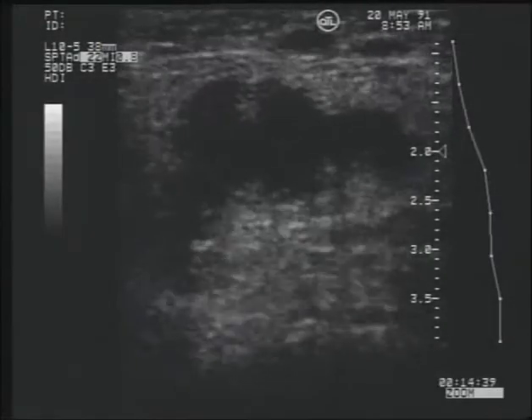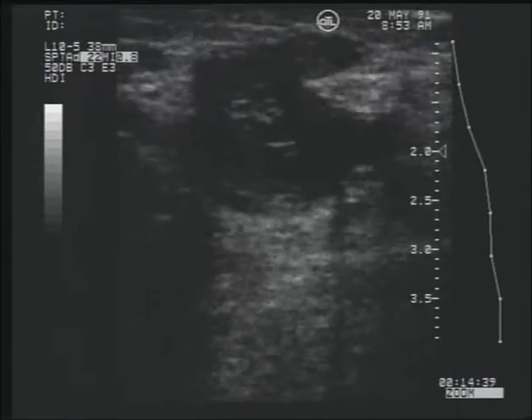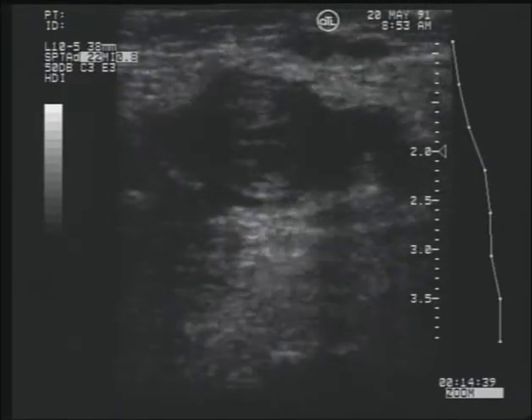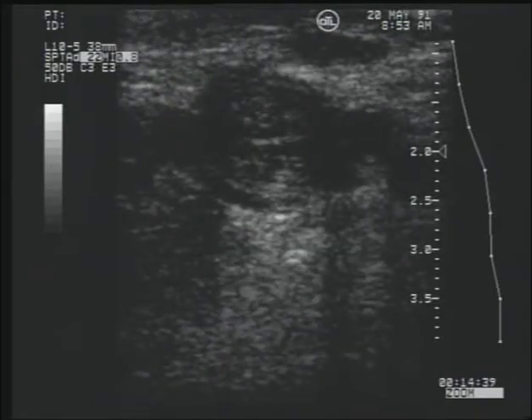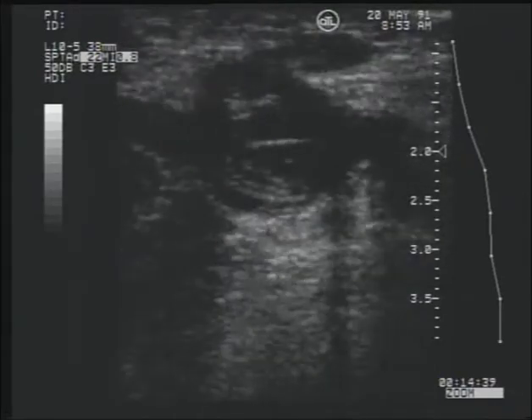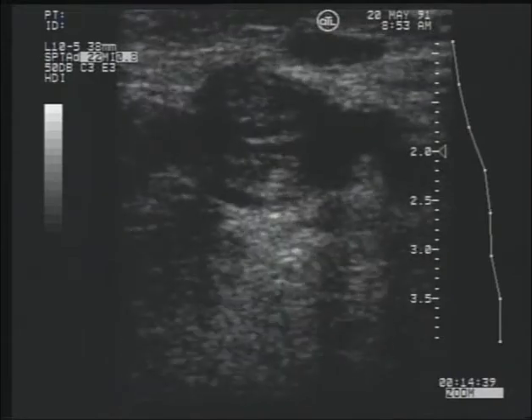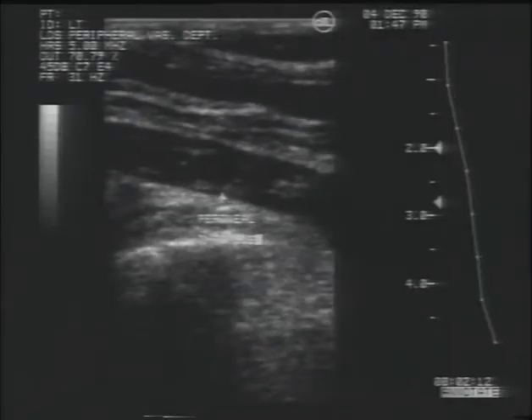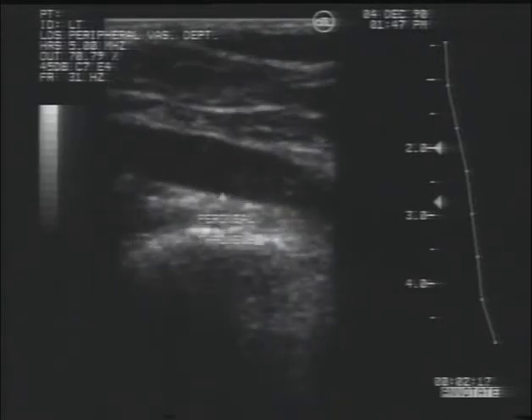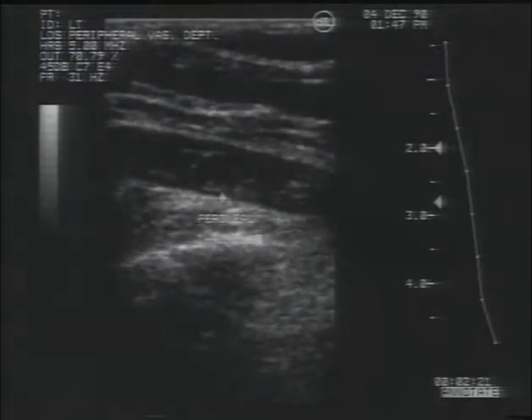As a newly formed thrombus grows, the vein enlarges to accommodate the blood flowing around the partial obstruction. The vein can do this quite successfully until it reaches its maximum caliber, at which time the thrombus completely fills the dilated vessel. When the vein is imaged in the transverse axis, it can be several times larger than an ordinary patent vessel. Newer clot tends to have a smooth border as opposed to an irregular one, although this observation is one of the least reliable indicators of the age of a given thrombus.